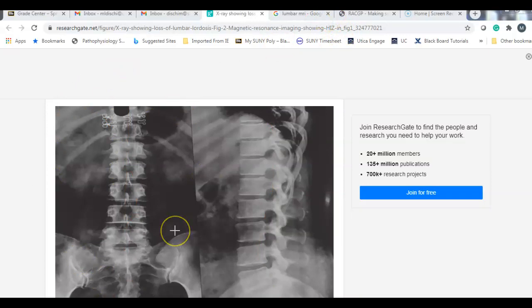So alignment. Bones. You could see here, I'm going to erase this. This vertebra is not quite as square. This one's pretty nice, healthy vertebra. And that's the body in the front. Should be about squarish. If you look down here, and once again, I'll erase this once I explain it. You're starting to get a bone spur here. I exaggerated that. And here, you're definitely getting a bone spur here and here. And then this vertebra is not shaped as well as those nice normal square ones.